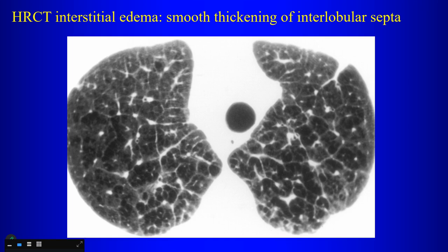What about the central lobular bronchiole? Do we see that normally on CT? Why not? Why don't we see the central lobular bronchiole on CT? The resolution. Yeah, the walls of the central lobular bronchiole are very thin, right? And the center is filled with air normally. So you usually don't see the central lobular bronchioles on CT because the walls are too thin to resolve.